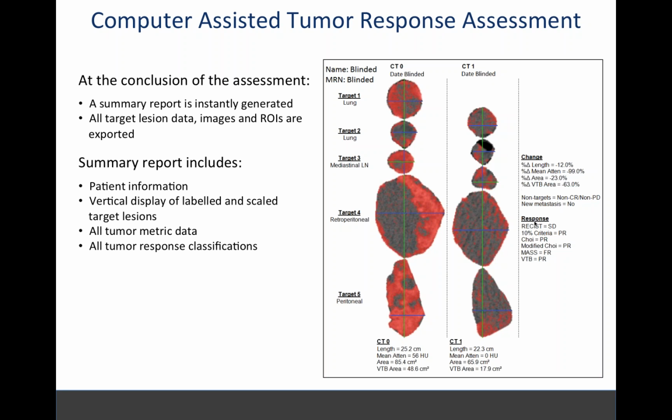And what you're seeing here is the patient information in the top left. Of course, we blinded this. This is a real patient from a real clinical trial. This is not Photoshop. This is actually what pops up. I'll show you that when we do our example here.